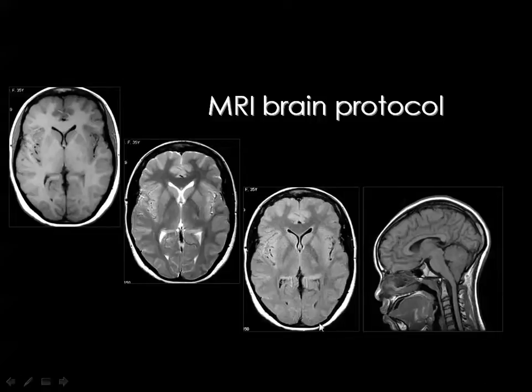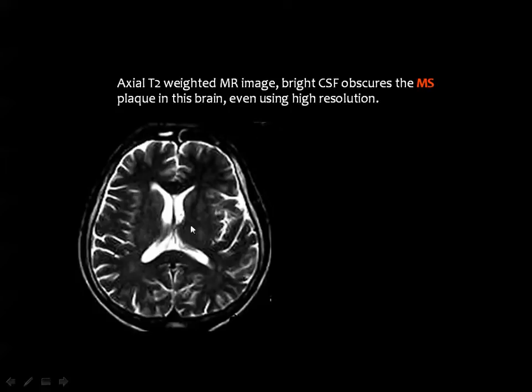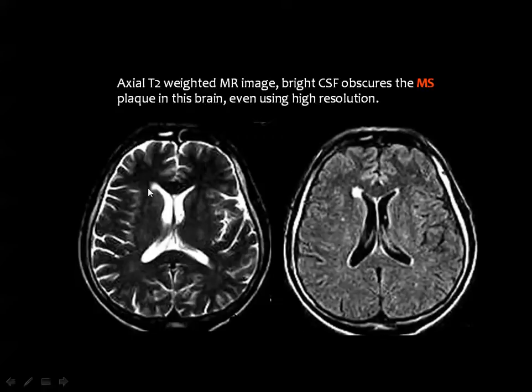What is the value of the FLAIR images? Let us look at this axial T2 of an adult brain with a lesion adjacent to the ventricle in this area. This lesion will appear in the T1 black, similar to the CSF, and in the T2 it will appear bright, similar to the CSF.